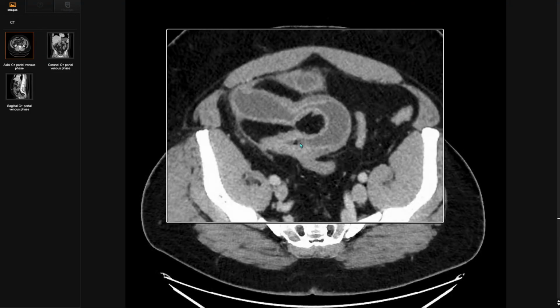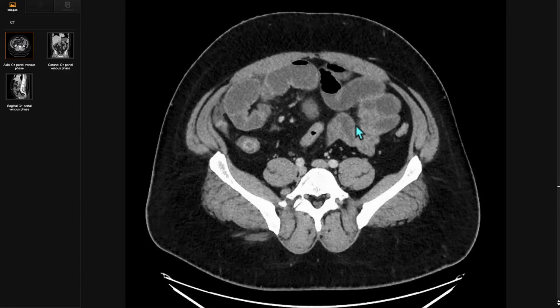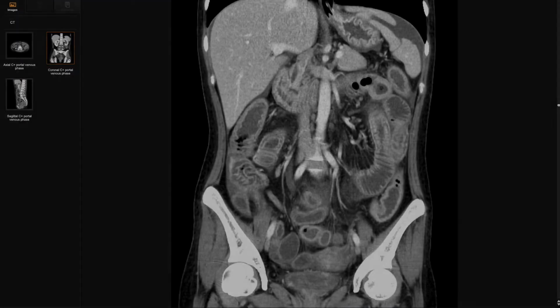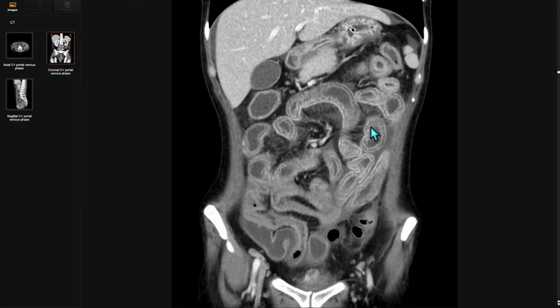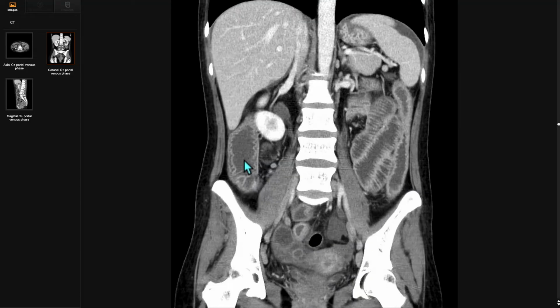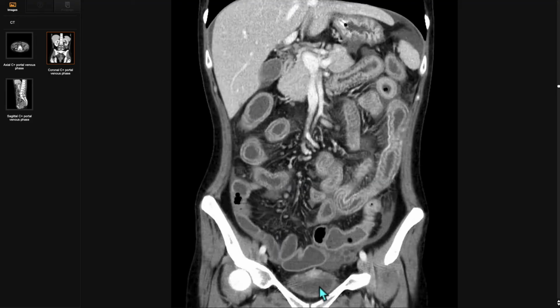This is related to Crohn's disease with multiple complex fistulas in the right lower quadrant, also causing a partial small bowel obstruction. This next case presents with dramatic increased thickening and inflammation of the entire gastrointestinal tract. It starts in the stomach, involves the entire small bowel, and also involves the colon. There are some other important findings that help us with this diagnosis.